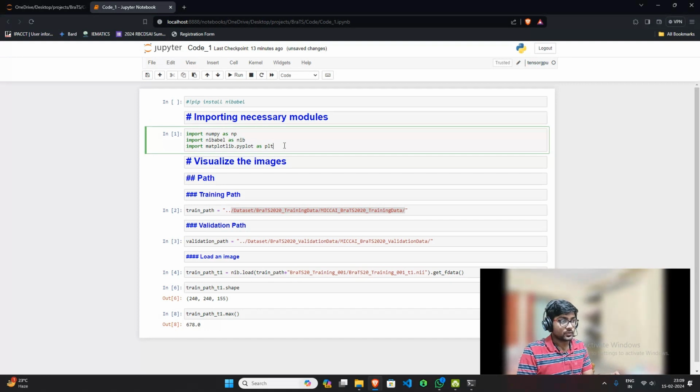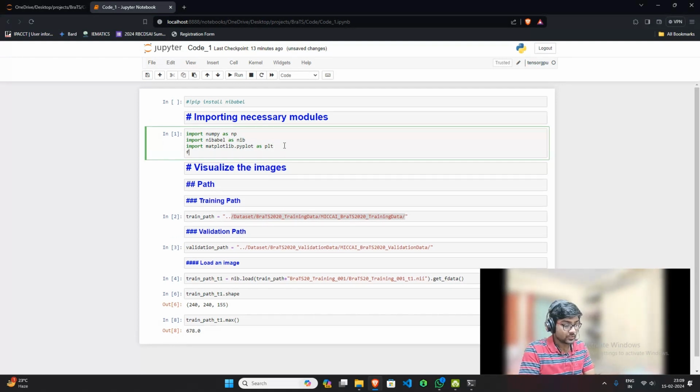So what we will do, we will import one thing: sklearn dot preprocessing. Again there will be a question of how to know from where we have to import. Just search Google. I know this because I've been using it, so that's how I know. If you don't know it, just search Google. There's no issue because one cannot remember so many modules. If someone has practice, that's a different thing, but if you don't have practice, there's no issue.